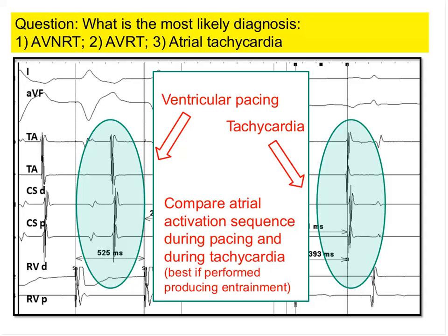Absolutely. If we have only two recordings, as in this case, and we see the finding, it is okay. If we don't see it, we have to look more. We have to repeat the maneuver, having recordings at other sites. Yeah, perfect. Thank you.